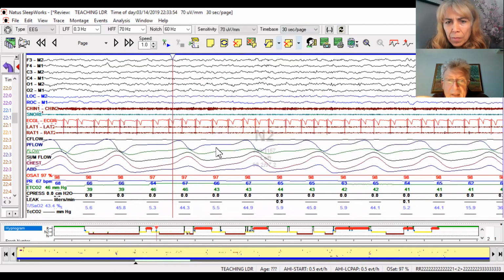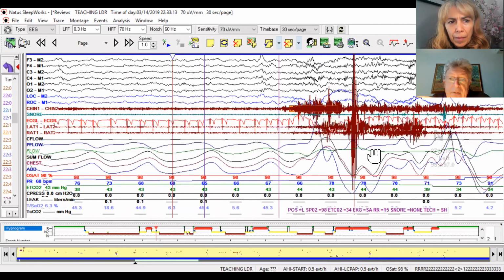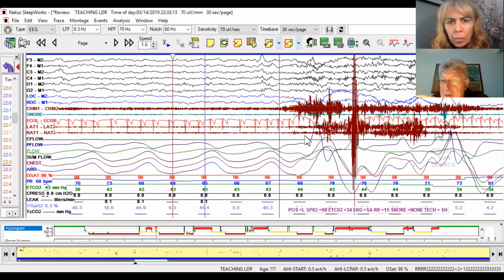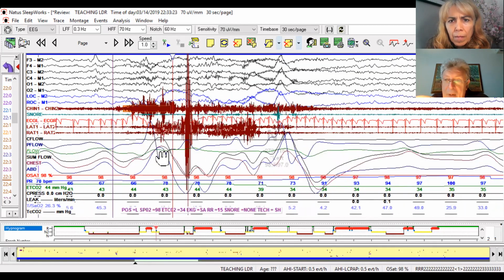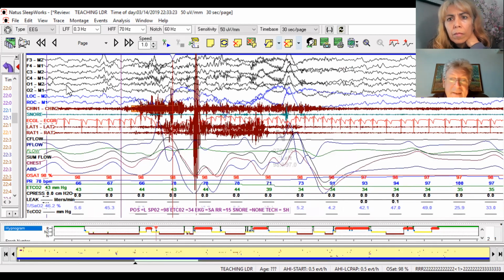The epoch before was different; this epoch was N2 and now it is N1. In my opinion, it would meet the criteria for wakefulness if this alpha rhythm that I see clearly lasts for more than 15 seconds.